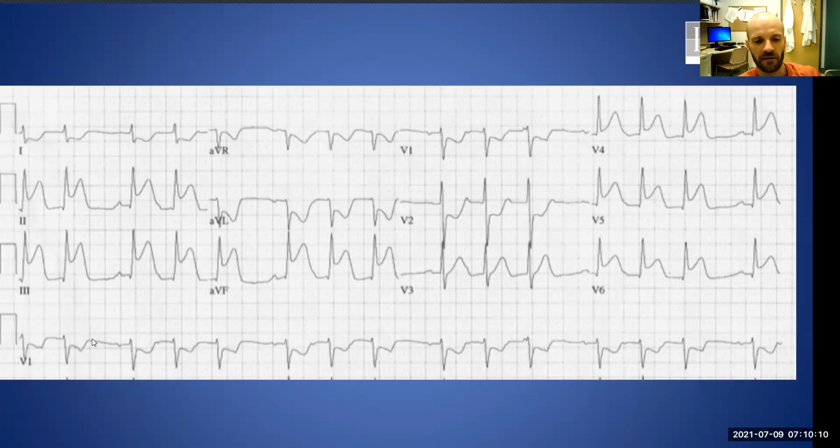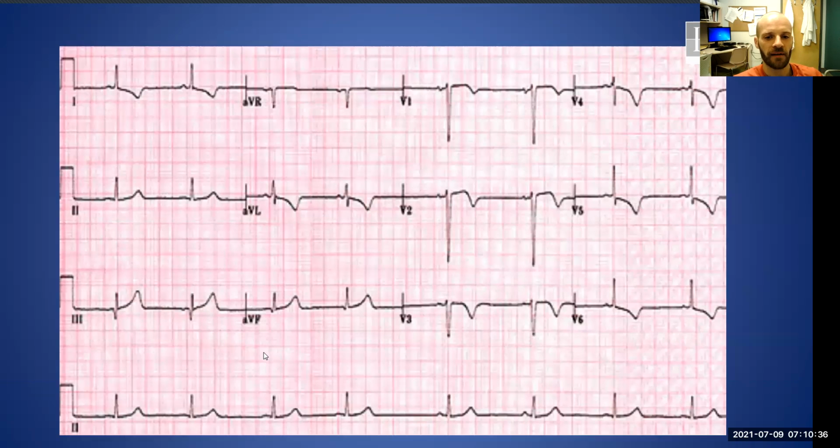So we're having an infralateral ST elevation MI with Wenckebach because the same coronary artery that supplies this region often supplies the atrioventricular node as well. So the AV node is getting damaged by this myocardial infarction. It's struggling. Electricity is still getting through, but the AV node is struggling, and it's starting to block. Okay. So very good, guys. Tricky one, that one. Next.